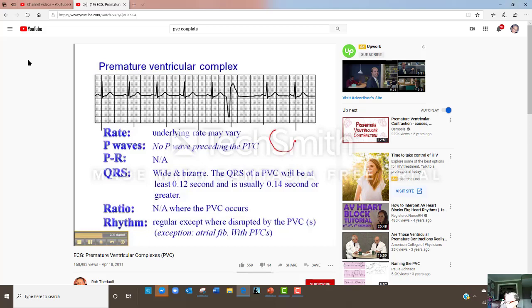But if you think about how we monitor patients, normally in lead 2 we have a positive electrode here, and in the underlying beats we can see the QRS is positively deflected, and that's because the wave of depolarization moves towards the positive electrode, so you get a positive QRS. But in the case of the PVC, if we move that over here, if you have a focus down here and the wave of depolarization is moving away from this positive electrode, then we get this negatively deflected QRS. So we know this focus is depolarizing in the opposite direction of these underlying beats. So that's just additional evidence that we're dealing with a PVC here.